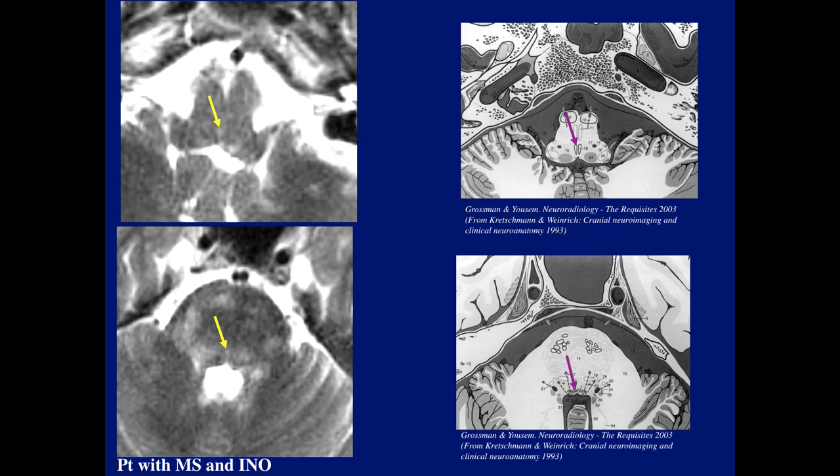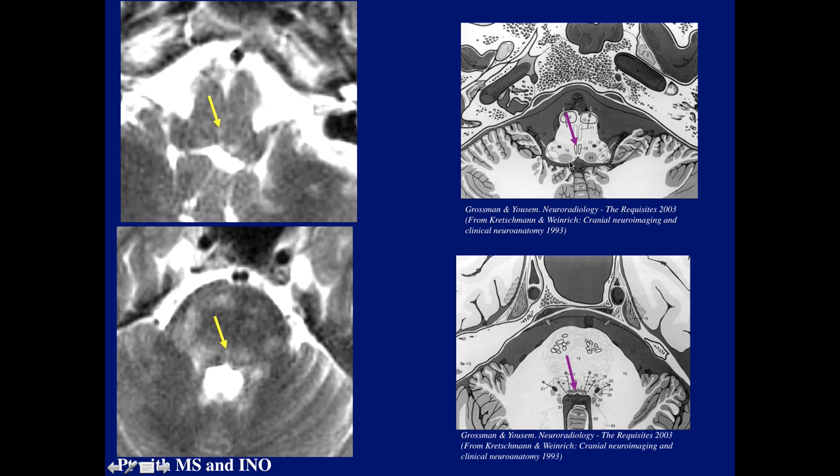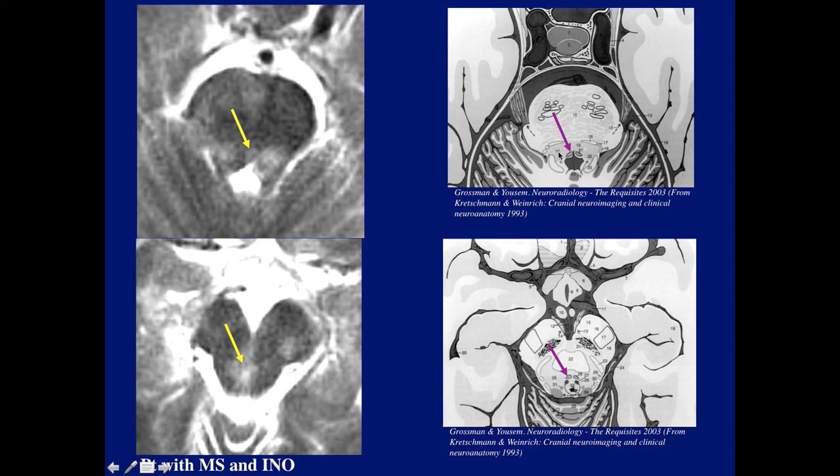medial longitudinal fasciculus. So this was, for instance, low down, and so all along the location of the MLF at the various levels. See, here it is, upper medulla, pons, upper pons at the level of the superior cerebellar peduncle, and even higher at the level of the peduncles. All these midline lesions could be damage to the MLF at various levels.